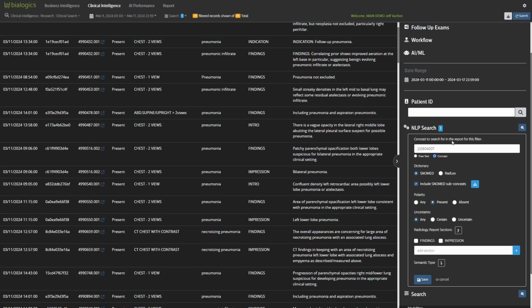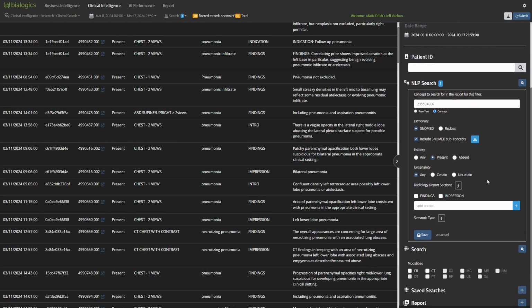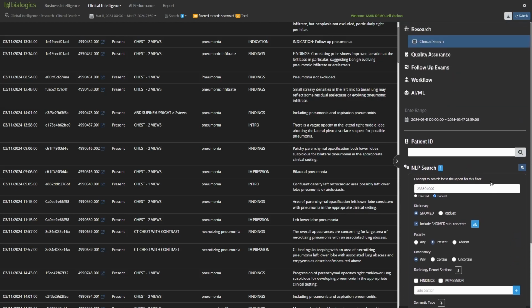Now, clinical search tools can become very, very multi-layered with a lot of search criteria to find very, very specific clinical criteria. And the processing of this only takes minutes, even though we've processed hundreds and thousands of studies in a short period of time. So this is very valuable for radiology research, or as I mentioned earlier, cohort identification for AI testing.